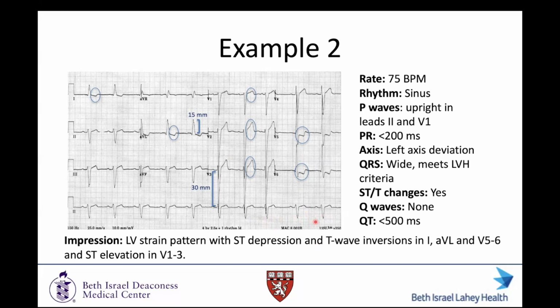The second thing I'll say with the width of the QRS, I think it depends who you ask. When the QRS is just around 120, I think you can explain that by LVH alone. This is almost sort of starting to want to become a left bundle. If you wanted to write incomplete left bundle branch block, I think that's fine too. You're getting toward a left bundle, but with substantial LVH, you can start to get there as well.